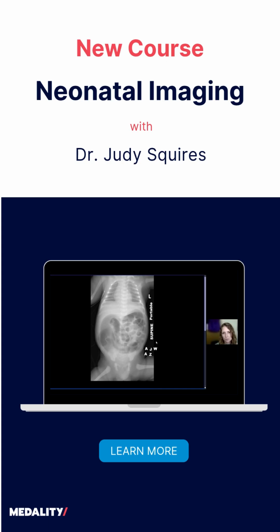And that's the appearance that we're going to have when we have such diffuse gaseous dilation of bowel throughout the abdomen. This is a distal bowel gas obstruction pattern. So the next step in the workup of this patient will be contrast enema.